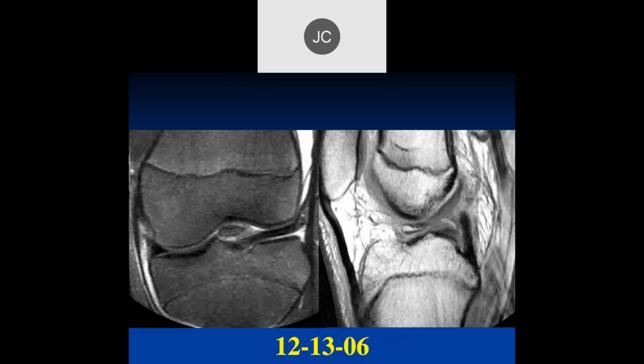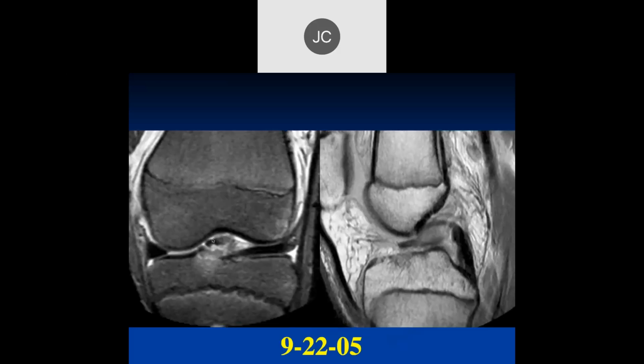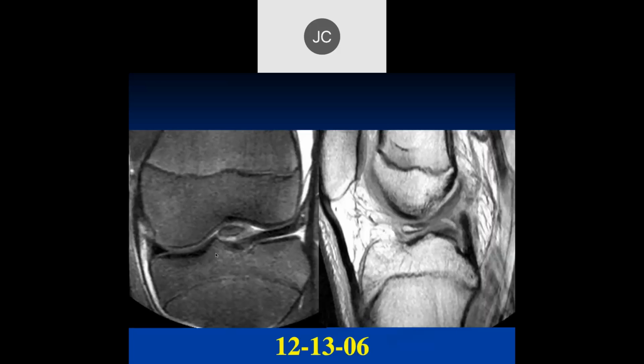So this is the reason why you usually want to surgically fix these down. In the acute setting, the bone will heal very readily as long as it's opposed and stabilized. Once you get in a chronic setting like this, where you have cortex all around it, it's much harder to get that bone to heal properly. So you typically prefer to treat these in the acute setting and not wait till they become chronic with chronic instability like we have here.